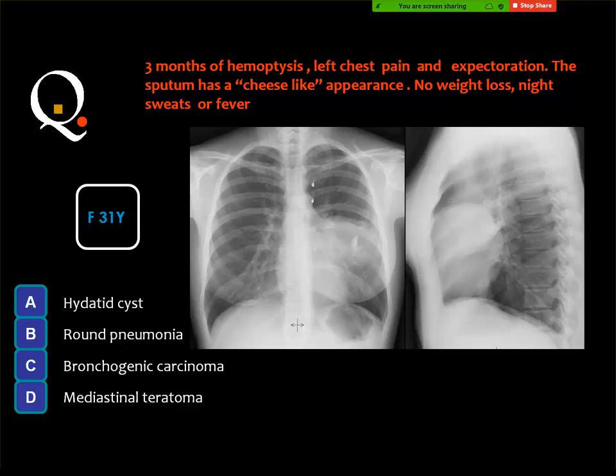And a patient with COVID-19, then you mention some atelectasis and so on. But usually you avoid it, because you know that the clinician may interpret this wrongly and let the patient do further investigations which are useless. Then it is better to avoid this atelectatic band except in the exam, because the examiner usually wants you to see everything in the film.